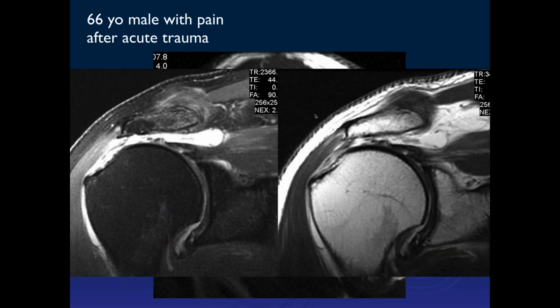So there's full thickness tear and retraction, significant retraction of the musculotendinous junction. So probably the sagittal cut was at the level of the musculotendinous junction. So if you look here, the distal end of the supraspinatus muscle is a cone. It has a point here where you have the musculotendinous junction, and then it gets larger more proximally.